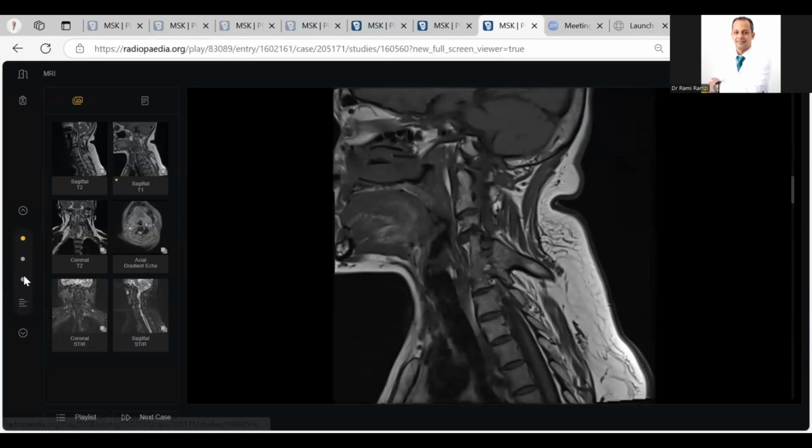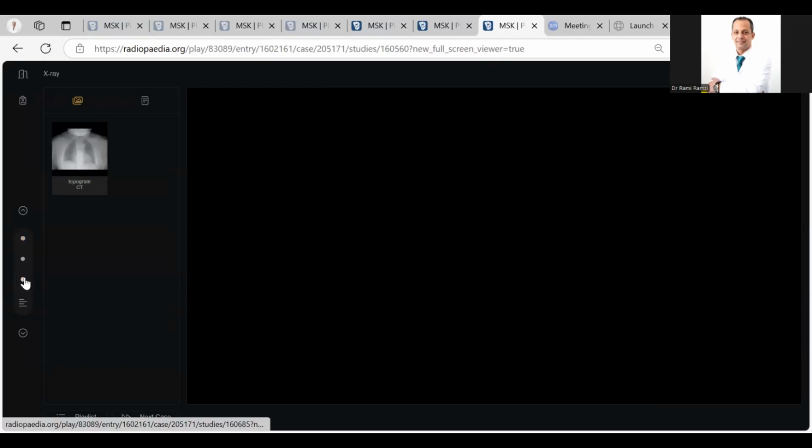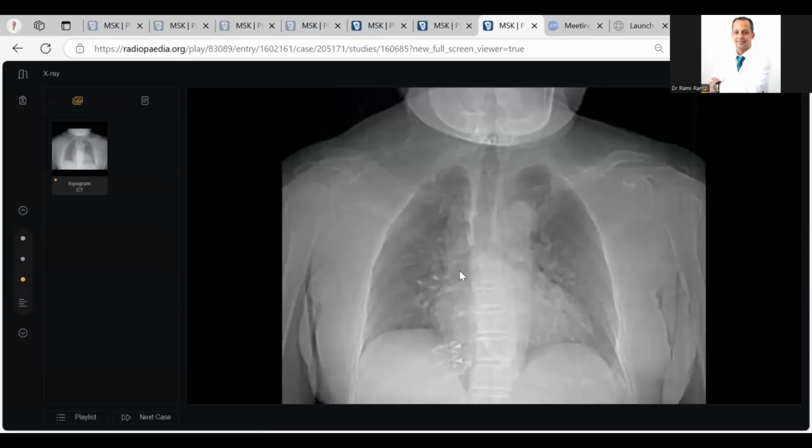In this case, the examiner started with an X-ray to confuse you with the normal heart and normal chest, but the pathology is here. Compare this scapula with this scapula. The scapula is elevated and rotated. Oh, this is a Sprengel deformity, and this is the omovertebral bone. So I should compare with the previous, or I should do MRI. Okay?